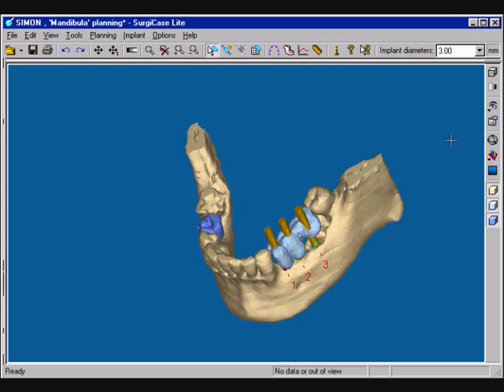Additional option is to view the model at a distance. This feature can be activated by setting the transparency. Viewing of the model has now changed.